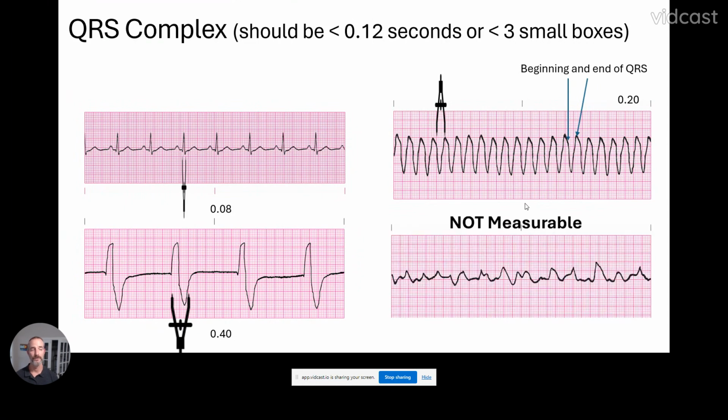And then you have ventricular fibrillation. These are fibrillatory waves, and there's no really obvious beginning to end. And honestly, with this patient, you're probably doing CPR, and hopefully you've got the pads on and doing a defibrillation as early as you can.